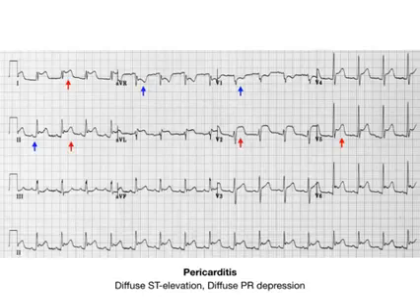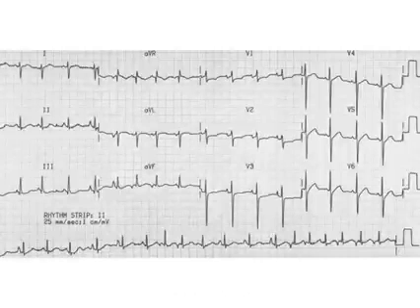What will seal the deal for this question is the clinical vignette. They will give you something extremely suggestive of pericarditis. So they'll give you all of the other symptoms of pericarditis and then show you this ECG, or vice versa, and want you to tie these symptoms together. So be aware that for pericarditis, you will see ST segment elevation, but you'll see it in all leads. You'll see PR segment depression, and if you see that on USMLE or COMLEX, your brain should instantly think about pericarditis.